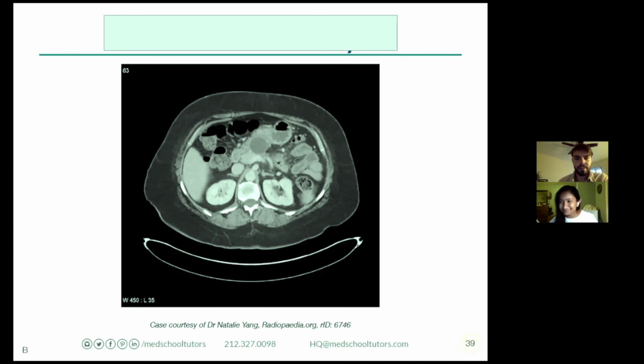All right. So taking us back to the abdomen, we always want to use our landmarks. So feet coming down on us, and I know I'm repeating myself a little bit here, but what I always say to my students is perfect practice makes perfect. I always want to think about the right things every question, because then I don't miss things. Okay, so as I'm looking here, I want you to look across and see, does anything appear abnormal?